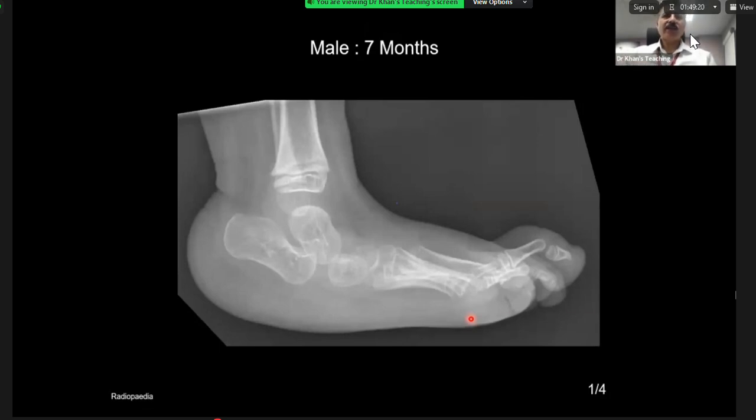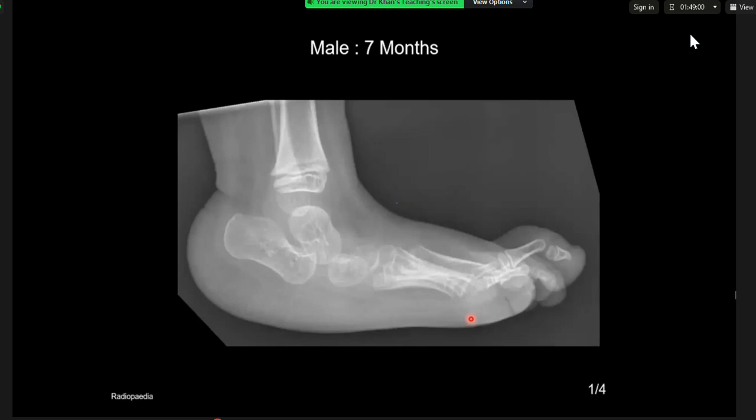Some of the others you are getting are feet and feet. So what is your diagnosis? Spot diagnosis. Five-second diagnosis. Are they missing their... They've got rocker bottom feet? Excellent, well done. And what do you mean by rocker bottom feet?